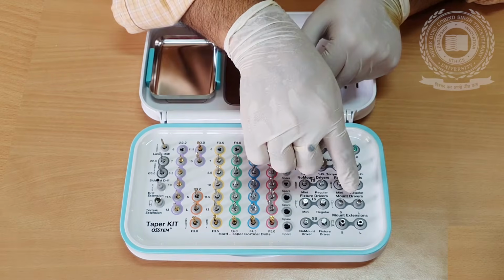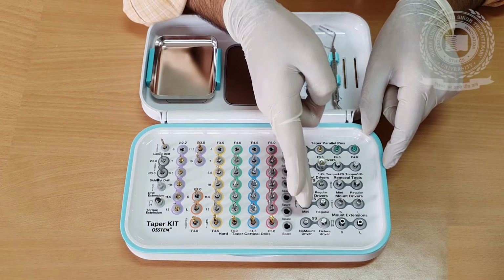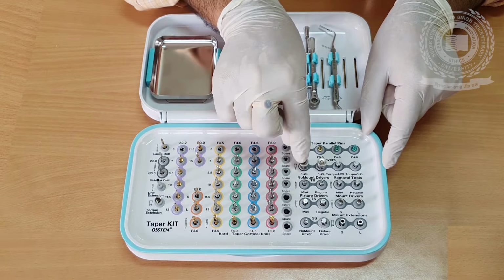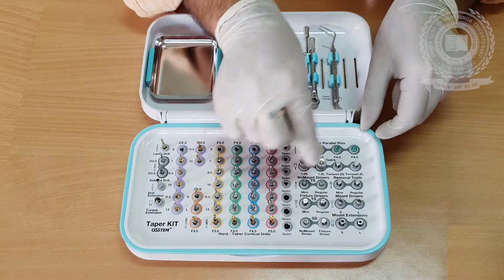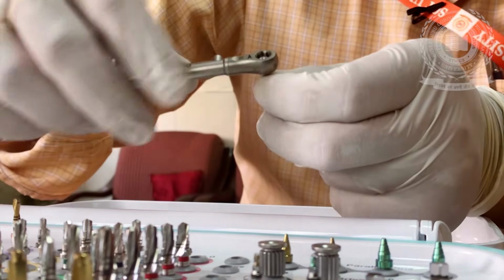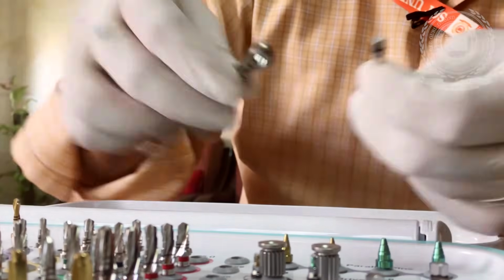As this company provides two types of implants, mount implants and no mount implants, similarly you can use the same instrument for the fixing of the implant or any prosthetic abutments. So these instruments are used manually, and this we can use with the ratchet which is provided with this kit to engage it.